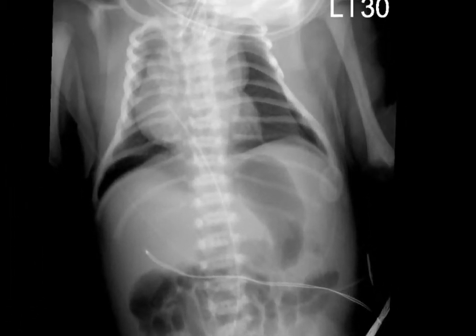This is a patient with very large bilateral pneumothoraces. There's clearly a subpulmonic pneumothorax on the right side, but in addition, the heart border should never be that sharp. So there has to be air outlining the medial aspect. That's outlining the cardiac border, so there's a lot of anterior air here. The same is true on the left side.